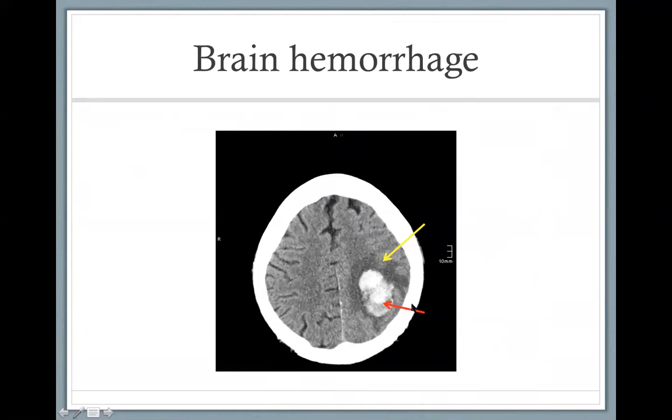We have seen an example of a tumor. Sometimes hemorrhage on its own, for example, patients who have hypertension might just have a blob of hemorrhage. Whenever you see hemorrhage, be careful, because sometimes hemorrhage might hide a tumor or a mass behind it, but they all appear the same, hyperdense because of the blood and surrounded by vasogenic edema. And contrast this with the previous image. So this is vasogenic edema compared to the cytotoxic edema, which we have seen before.